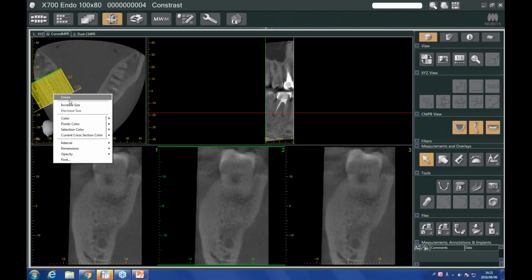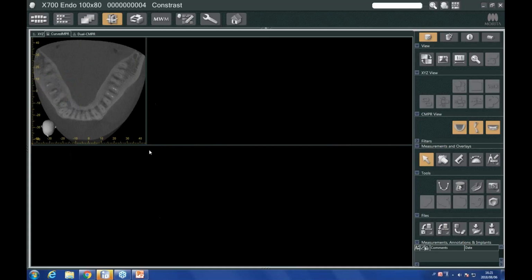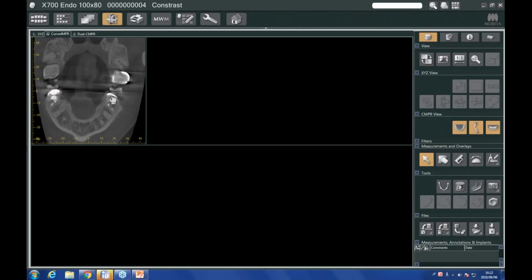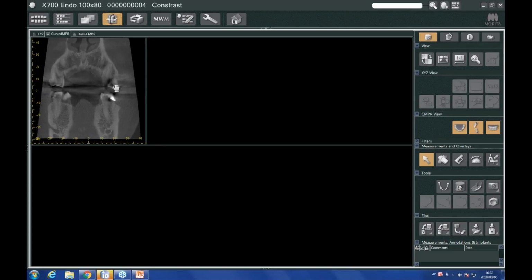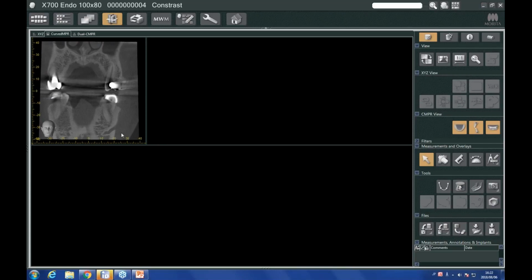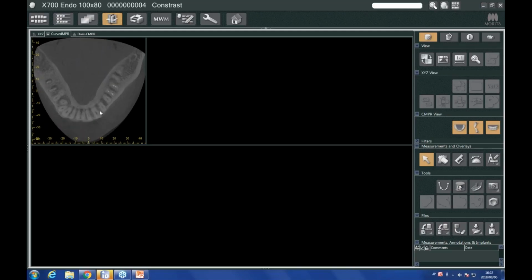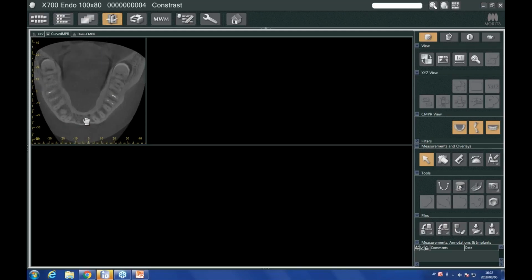Now, in the same way, for endodontists, we're not necessarily tied to this dental arch. Once the spline is removed and the image is just the way it's shown here, I can just left click and I can actually pull this up to be more of a patient front orientation. Okay, this is just me moving the image in, basically grabbing the patient's chin and lifting it up.